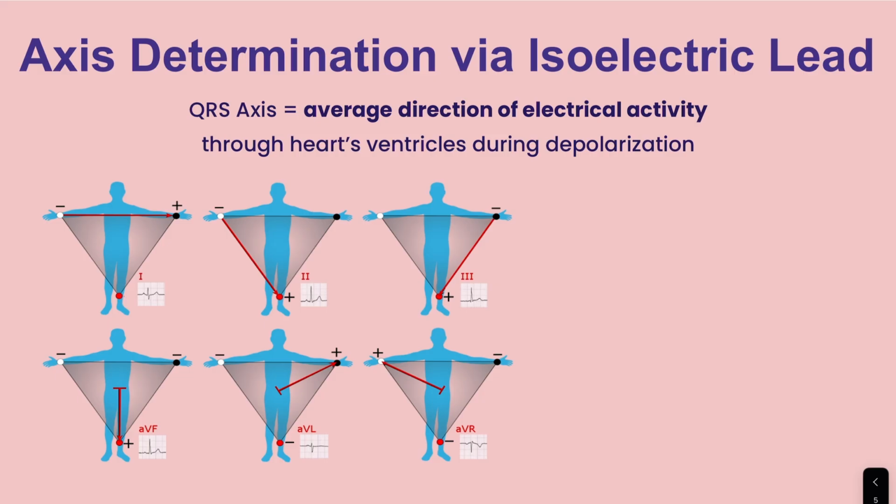It's a force going a specific direction to create this uniform contraction. The QRS axis is what we call that bulk of the flow, where most of that electrical current is going. We can give that a numerical value in degrees, and that helps us understand more about what's going on inside of the heart.